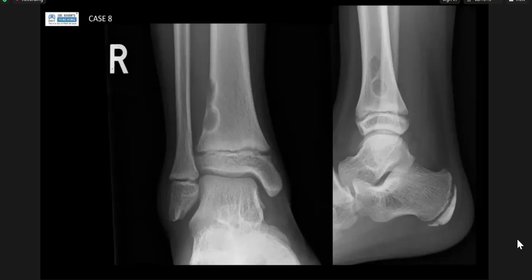Candidate 2? Yeah. So I'm given the frontal and lateral radiograph of the right ankle joint of a skeletally immature patient. I can see a well-defined eccentric cortical-based lytic lesion in the lateral distal cortex of the tibia, with well-defined sclerotic medial margins, narrow zone of transition, no periosteal reaction, and some deficient cortex on the superior part.